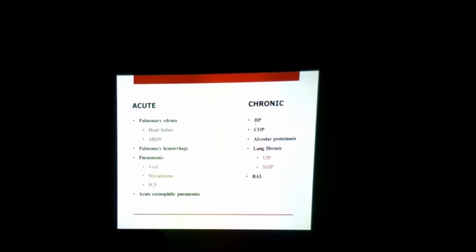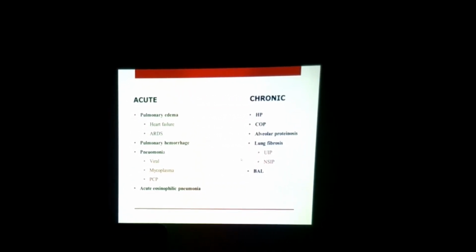Okay, this is ground glass haze. If it is acute, you should think of edema, hemorrhage or pneumonias. If it is chronic, you should think of hypersensitivity pneumonitis or NSIP or alveolar proteinosis.